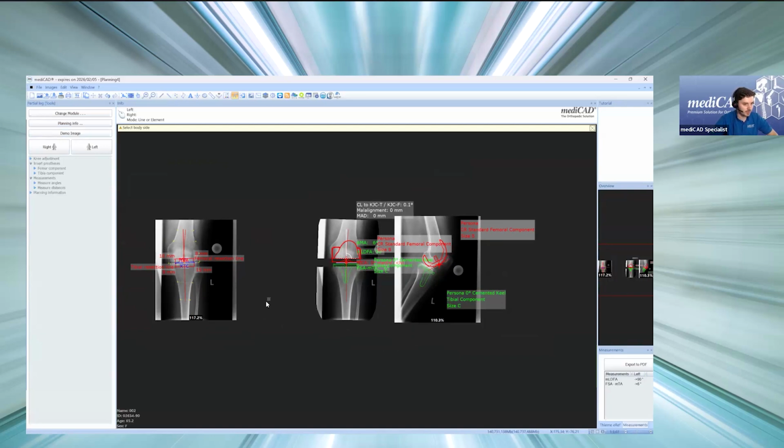Okay, quick question. Is this update for 2D and 3D, or only for 2D? It is only for 2D. This update is mainly for 2D. Yeah, all the things that we will discuss here and all the improvements are in the 2D application.